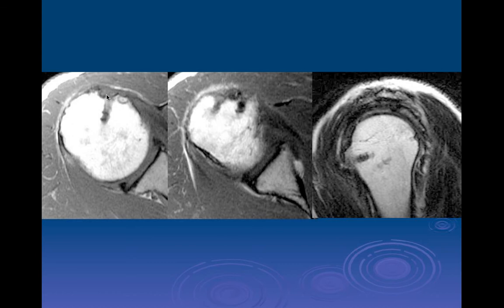Right. And you wonder if there might have even been a tenodesis lower down, but yeah, that's exactly what happened. And as John said in our last lecture, very often disease of the biceps is associated with rotator cuff tears. Actually, the rotator cuff tears are often the primary pathology, and the secondary injury is the biceps tendon. This is actually part of a supraspinatus tendon repair here with that suture anchor.